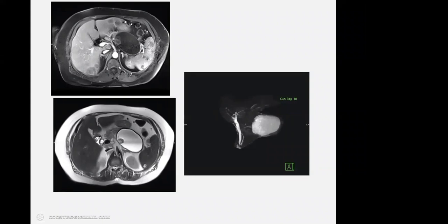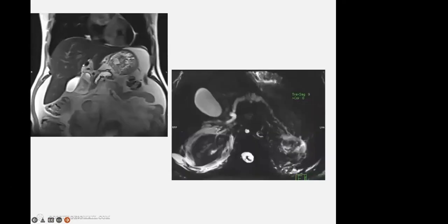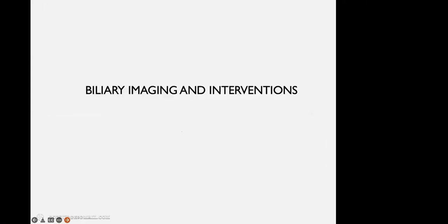Okay, fine, no problem. First of all, understanding MRI would be a huge thing. From an abdominal perspective, I tried to figure out those things which would be mostly useful for the surgical students, who need to see the MRCP, the T1 weighted sequence, T2 weighted sequence, and the MRCP sequence. In MRCP, the last slide would be showing some choledocholithiasis.